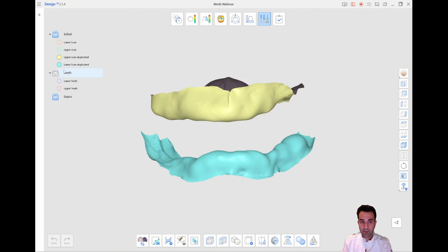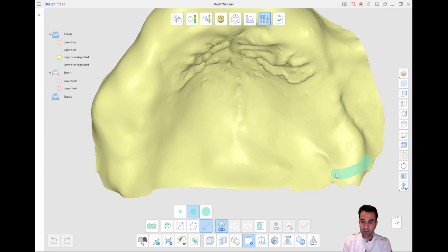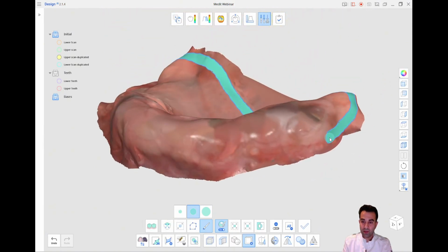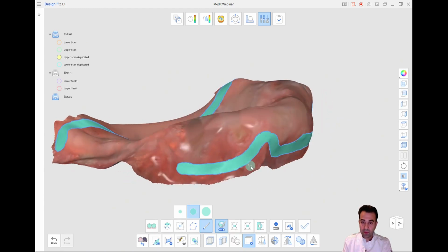The next step is we need to make the denture bases. We're going to use the edentulous arch to duplicate a selected area, which is technically we're going to trace the borders. Where do we want to extend our denture base? You can activate texture. Seeing color would allow you to distinguish between keratinized attached gingiva and the mucosa. You can see in here I'm giving space for the frenum.